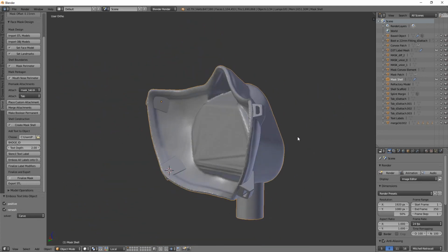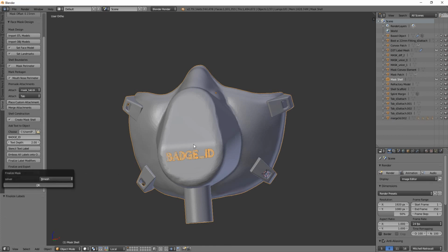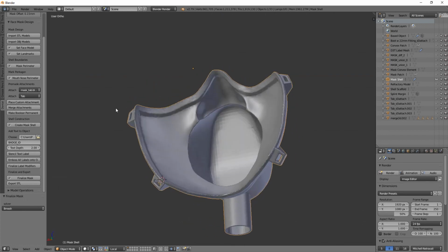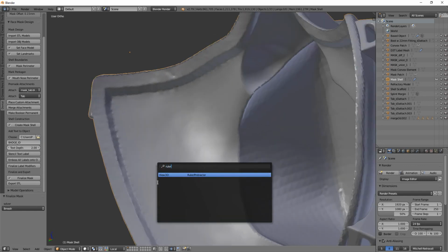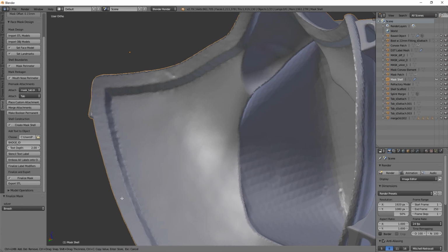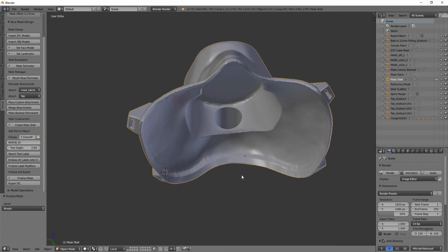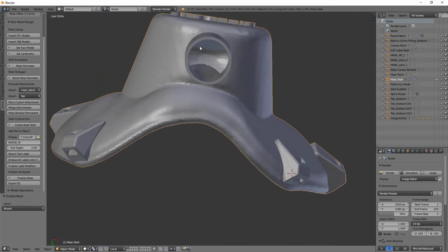So now we are ready to finish this up. So I'm going to press finalize label modifiers, make sure that that's good, and it will weld that permanently. And we'll finalize the mask. What that's going to do is subtract out all the space. So you see we've got our peripheral seal here, and that peripheral seal should be about 5 millimeters wide. Yep. So now you're ready to export, and the hole is through there.